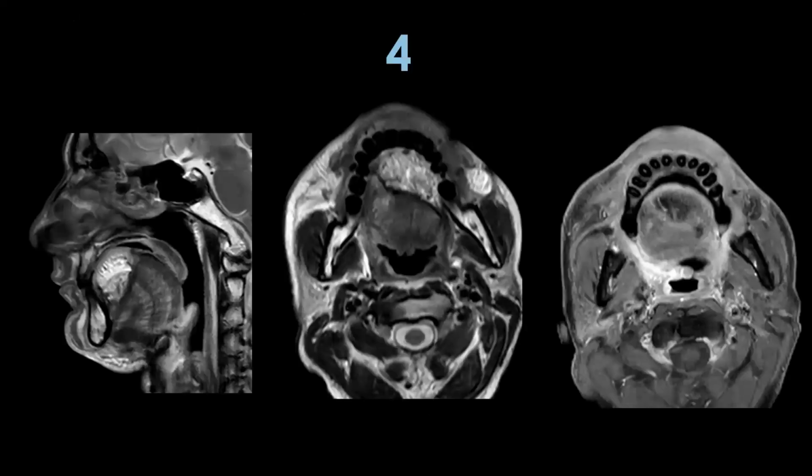Last case. It is a lesion of the upper alveolus. MRI. Sorry. The anterior tongue is involved. Okay, so the mandible is free. Tell me the sequences. CSF is hyper, so that is T2. The second, third image is also T2, and CSF is again hyper. This is T1 post contrast. So it is an anterior tongue lesion. It is crossing the midline, and the mandible is free.